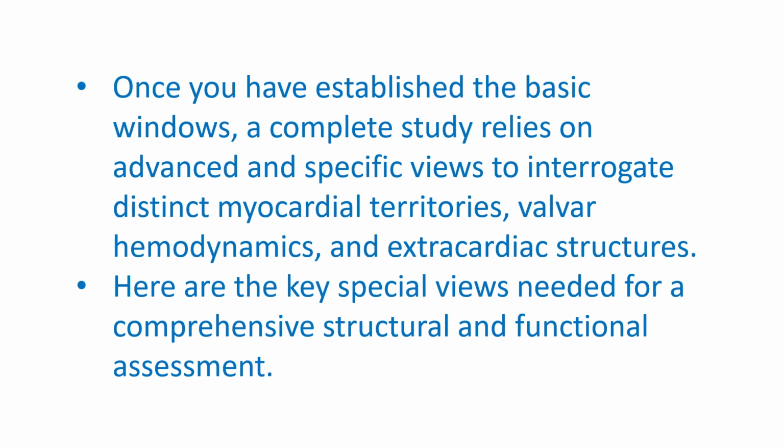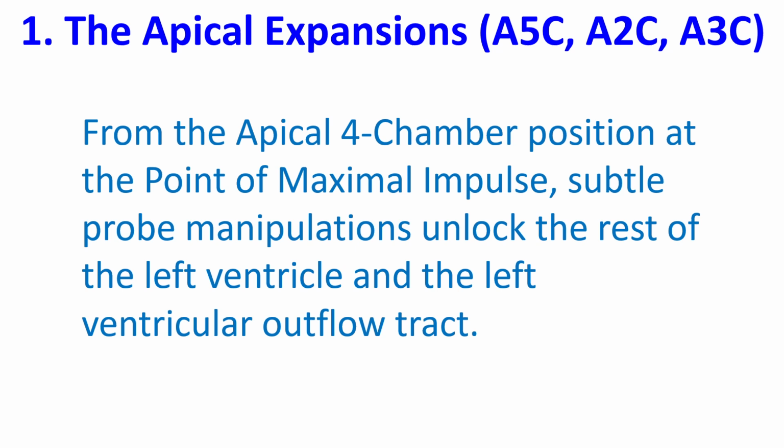Once you have established the basic windows, a complete study relies on advanced and specific views to interrogate distinct myocardial territories, valvular hemodynamics, and extracardiac structures. Here are the key special views needed for a comprehensive structural and functional assessment. Expansions of the apical view.